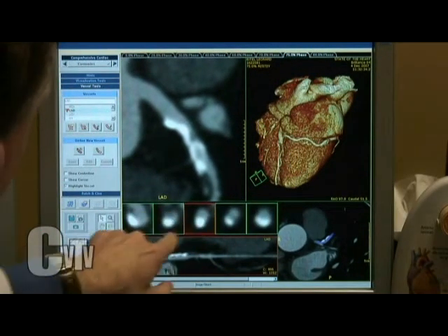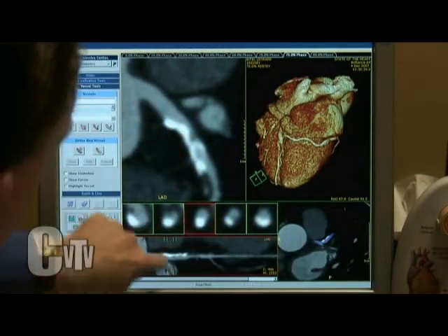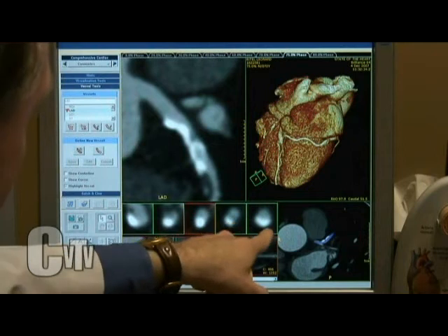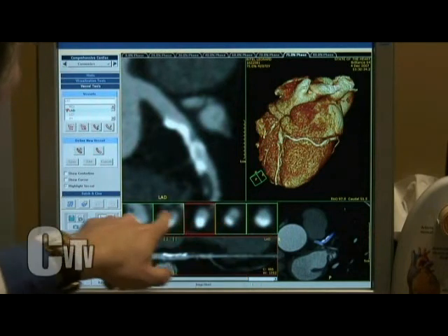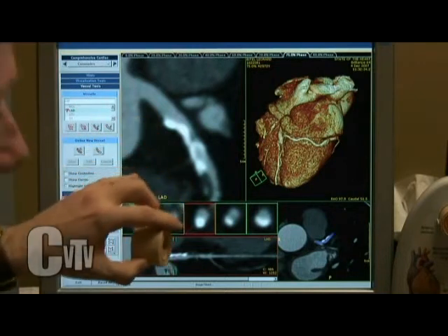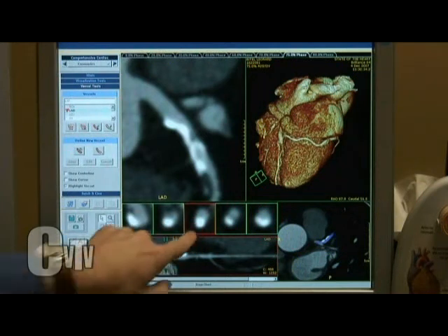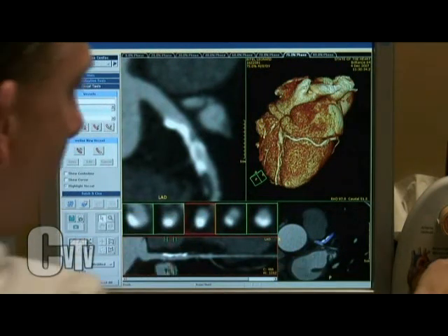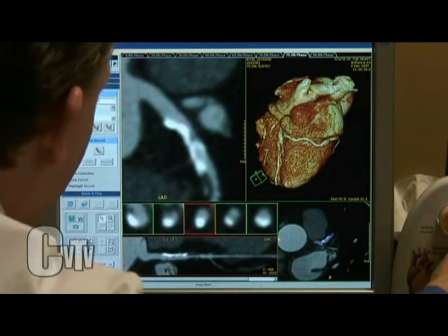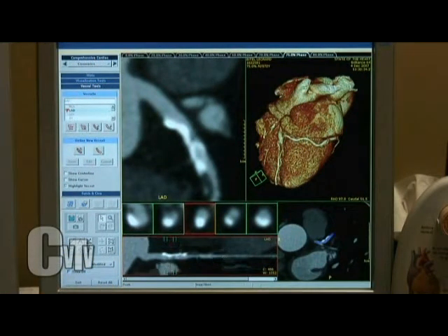But note the channel here, particularly at this location, as we cut directly through that blood vessel, that's the cross-section here. These are the cross-sections 1 and 2 millimeters downstream, and the cross-sections 1 and 2 millimeters upstream. Looks just like that. So what we're seeing is just like our model. This is plaque that's grown outward. There's no blockage, there's no obstruction, but there's a significant amount of plaque there. But also we can characterize the plaque at that location. It's a calcified plaque that's relatively stable.